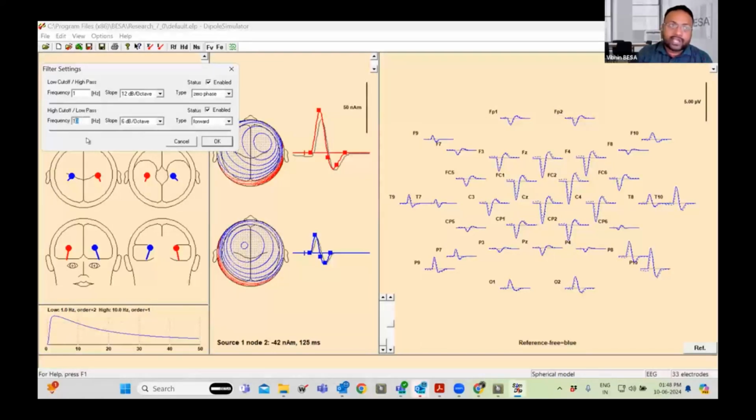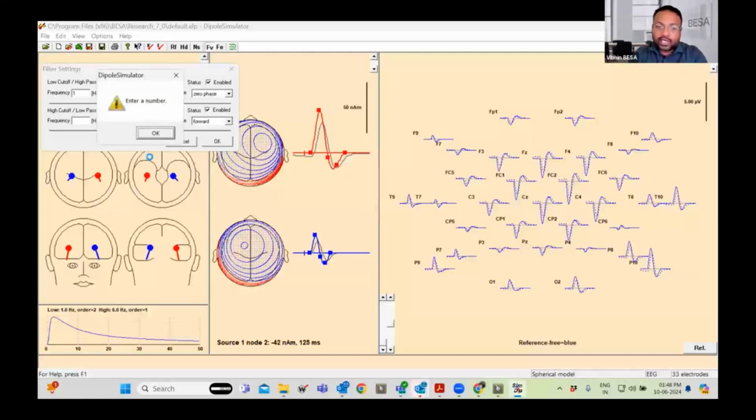But when I change this high frequency close to this frequency of interest, 6 hertz, you can still see it has moved a lot. So the low frequency filters, when you apply, really affect this, and high frequency filters are not that much affecting. So the main takeaway message shared here is, please ensure you give sufficient breathing space for the filters so that the filter limits don't really affect your data.